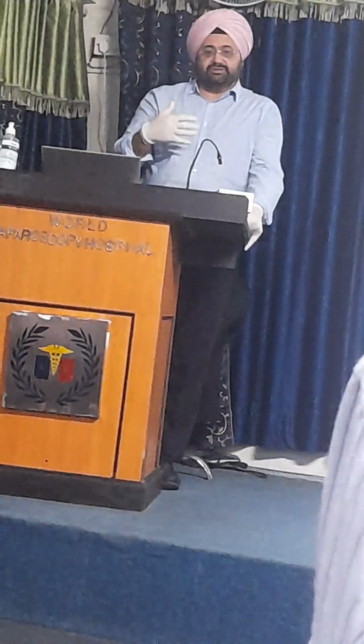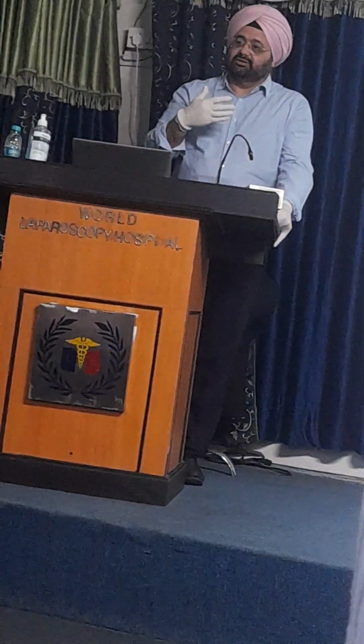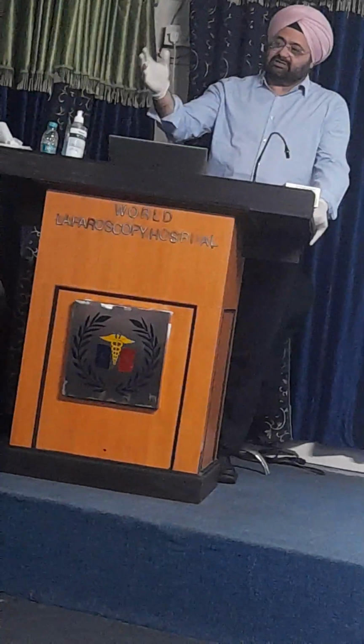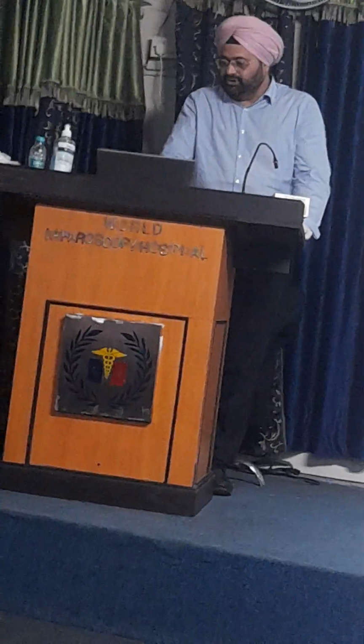You can capture an image. If you want to discuss this image with someone, you can just freeze that image there. You can magnify the image, plus all the things which we discussed earlier. NBI mode is there. You can connect an EUS to this. An EUS scope would be very similar to this, except that it will have an ultrasound transducer. These are your video endoscopes.